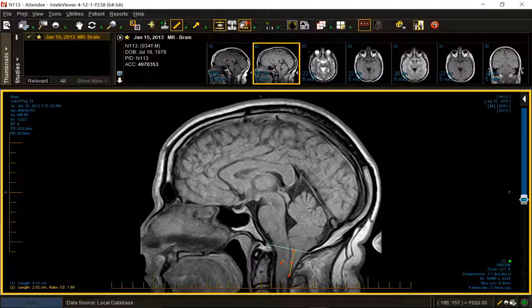We do have a syrinx. There it is, right on the bottom of the film edge. If you hit 0, well, actually it doesn't work. But if you look right underneath, if I could lift it up a little higher maybe, you can see that little slit-like syrinx being covered up by a few yellow lines. So the diagnosis of Chiari 1 malformation is made.